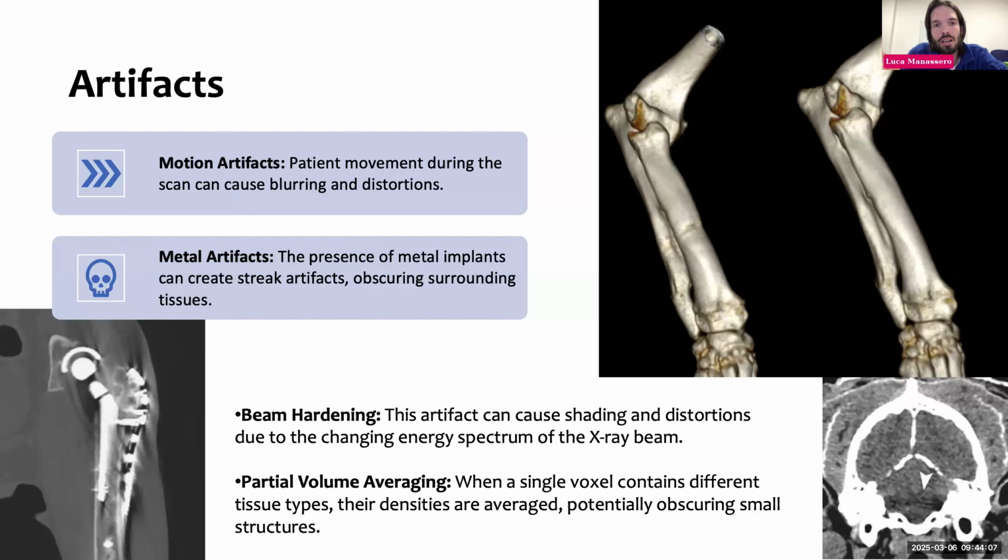If a vet gives you a CT like that to reconstruct and maybe do an angular limb correction, it would not be ideal to make a guide system on these artifacts. The proper scan is on the right, without the motion artifact. This looks like just a fracture.